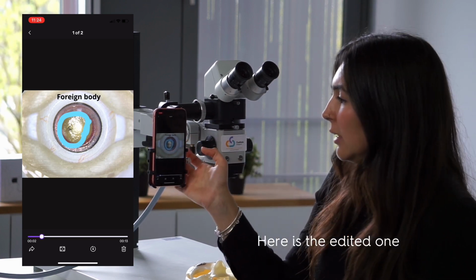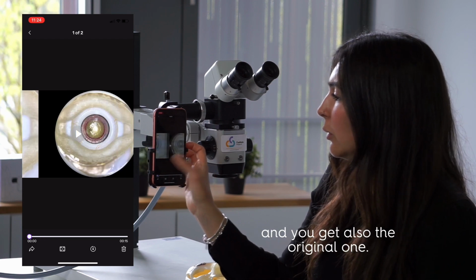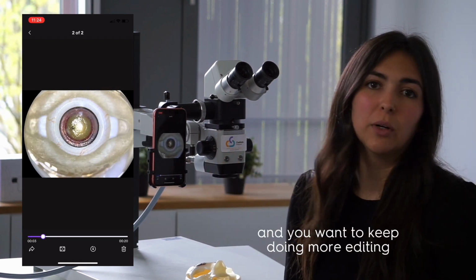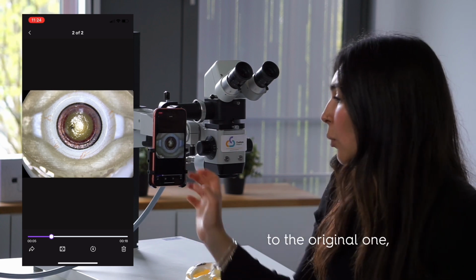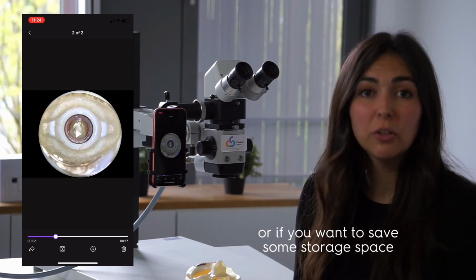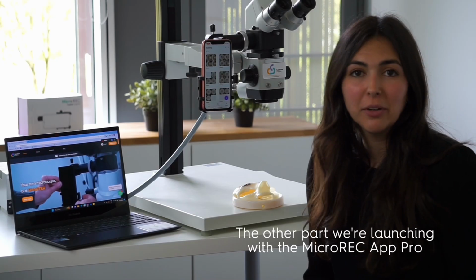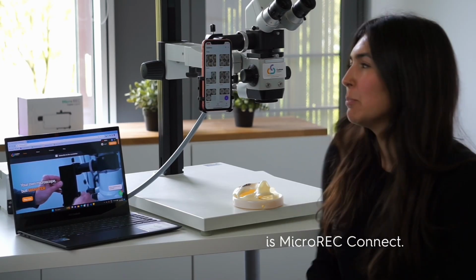So here is the edited one, and you also get the original one in case you want to keep both and you want to keep doing more editing to the original one. Or if you want to save some storage space and you don't really need the original one, you can always delete it. The other part we are launching with the MicroREC App Pro is MicroREC Connect.